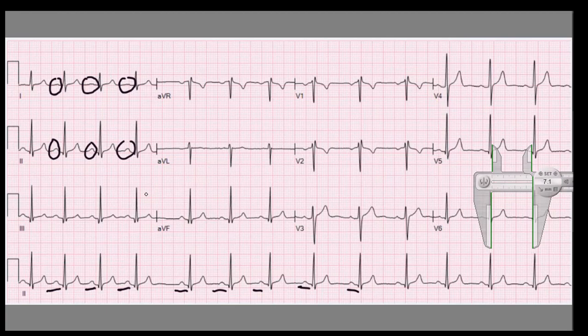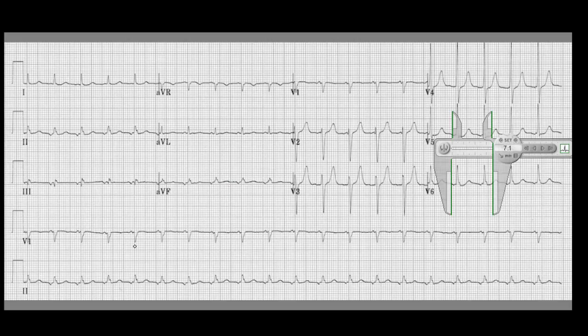Let's try it on another ECG. These are P waves, and these are negative in lead 2, and yes, negative in lead 1 too. Not that noticeable in lead 1, but yes, these are negative, so that's not a normal sinus rhythm. The P waves appear similar in shape here, and the P to P and R to R intervals may also be regular. I haven't checked that, but since P waves are negative in lead 1 and lead 2, that's not a normal sinus rhythm.